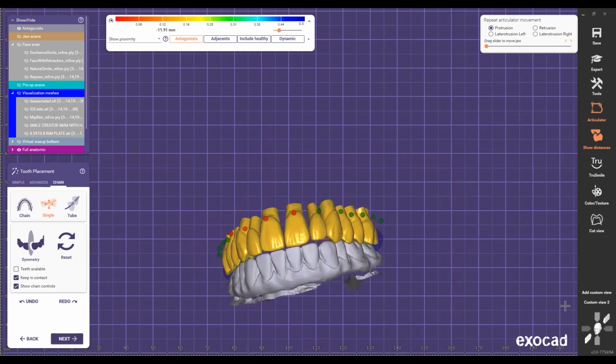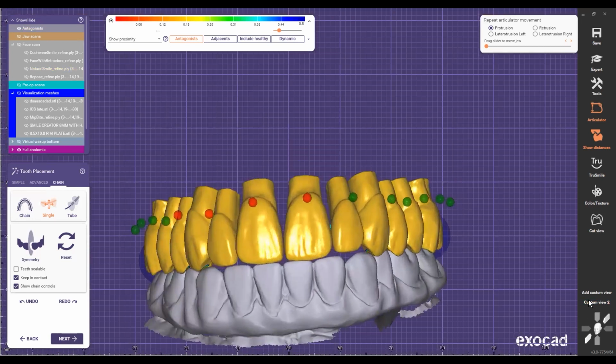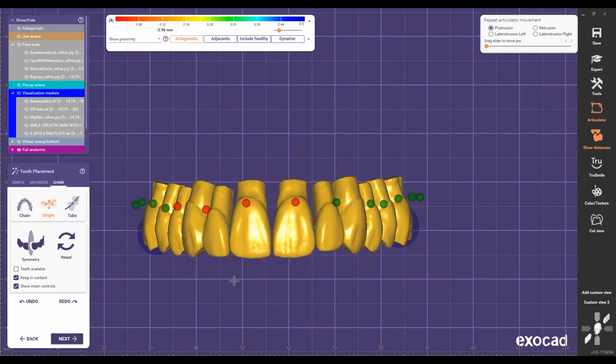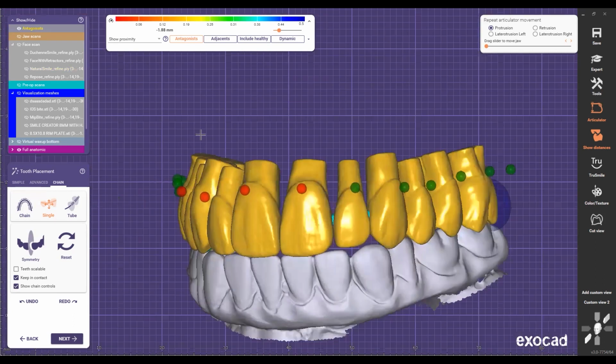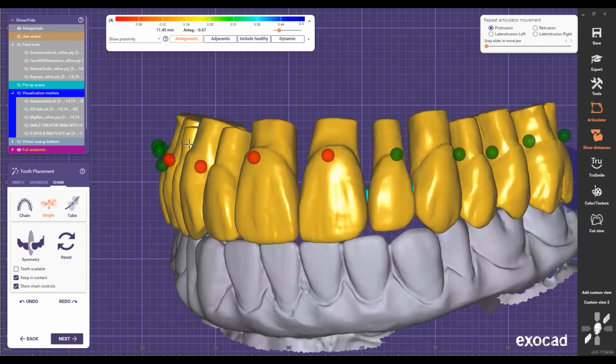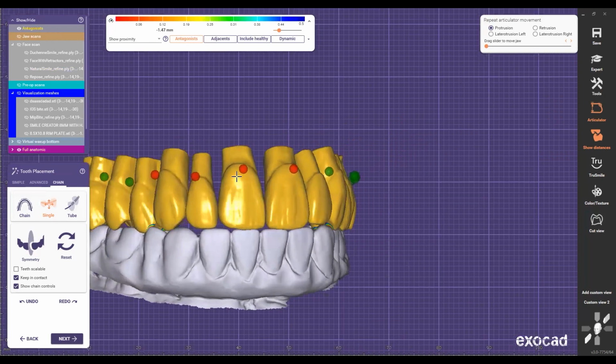Okay, so that way, once I fix the right side of the patient, I'm happy and I say, okay, now I'm done, and I can see that everything looks good. I'm just gonna visualize it from the side and then start moving, I call it the banana effect, right? The banana effect is just looking from the profile. When you put the bananas like that, they look nice, so I like to see that here.